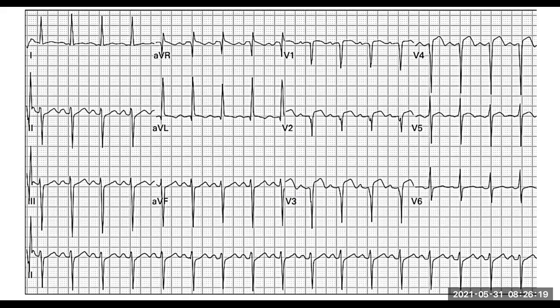Okay, right. So now we have done that. We've put our ECG on. We suspect a myocardial infarct, pulmonary embolus. Now our ECG is going to help to guide us. All right. So let's have a look at our ECG then. So the first thing we're going to try and work on is the axis.